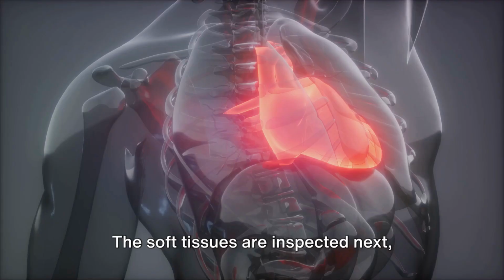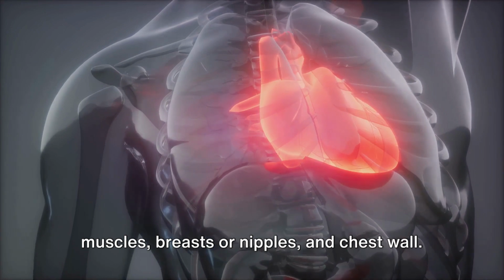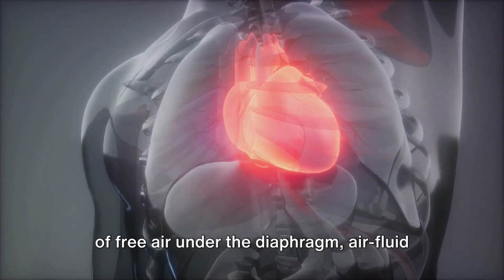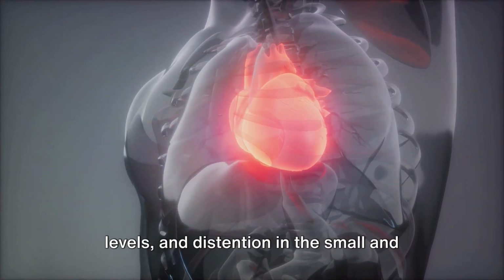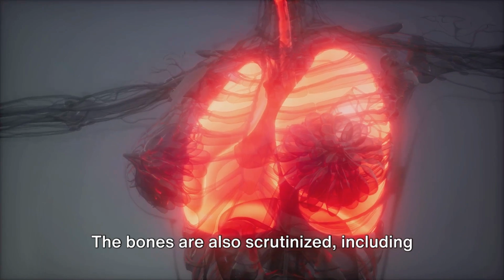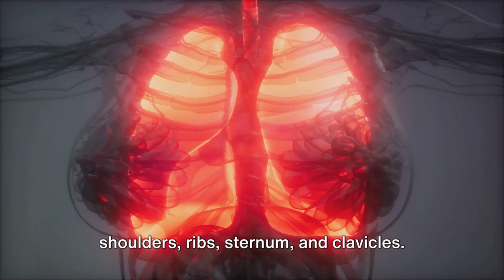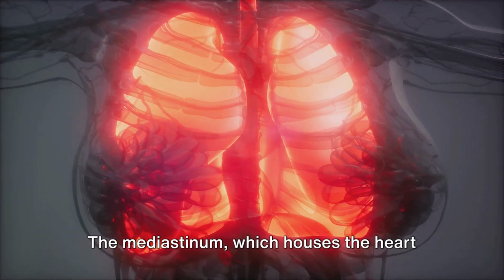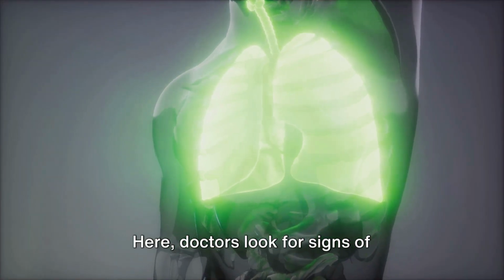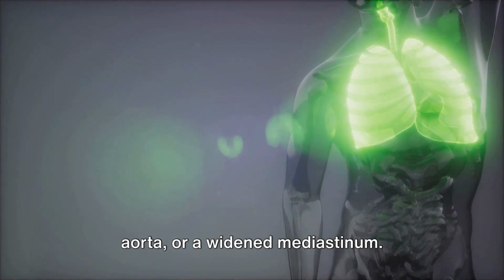The soft tissues are inspected next, including the neck, axillae, pectoral muscles, breasts or nipples, and chest wall. Then the abdomen is examined for signs of free air under the diaphragm, air fluid levels, and distension in the small and large bowels. The bones are also scrutinized, including the cervical and thoracic spine, shoulders, ribs, sternum, and clavicles. The mediastinum, which houses the heart and great vessels, is evaluated next. Here, doctors look for signs of cardiomegaly, tracheal shift, a tortuous aorta, or a widened mediastinum.